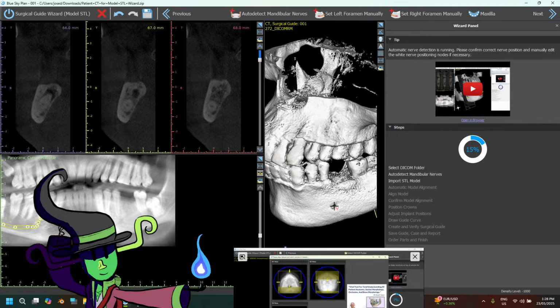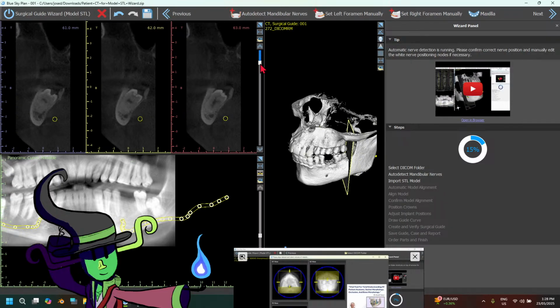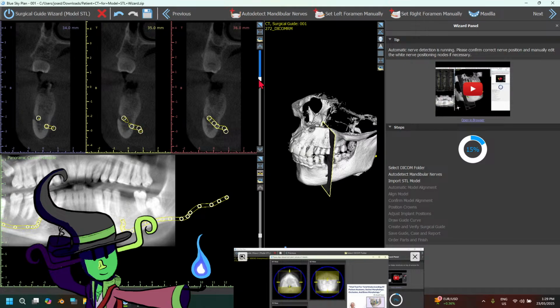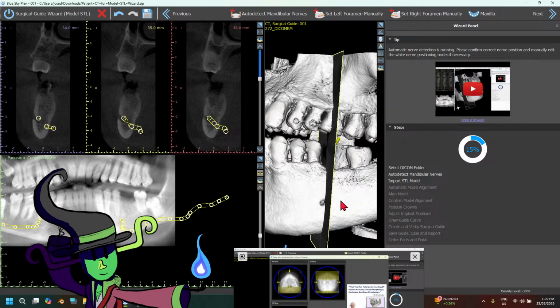Let's click on this here. Okay, let's see. If you're wondering what slice I am looking at right here, it's basically whatever slice this rectangle is landing on. That doesn't make sense. What are you doing? Let me do this one more time.